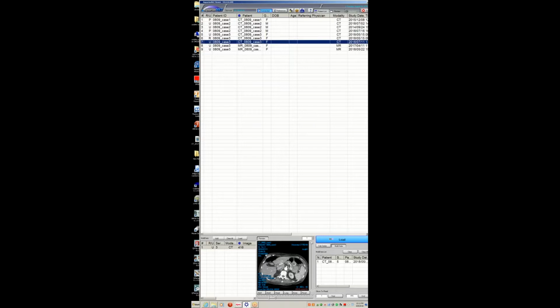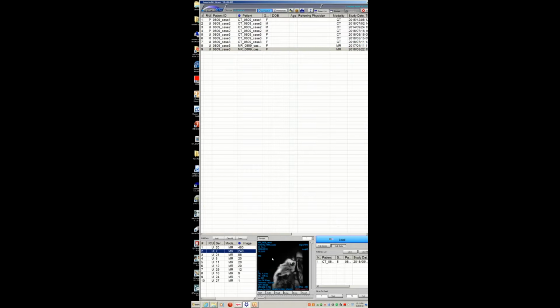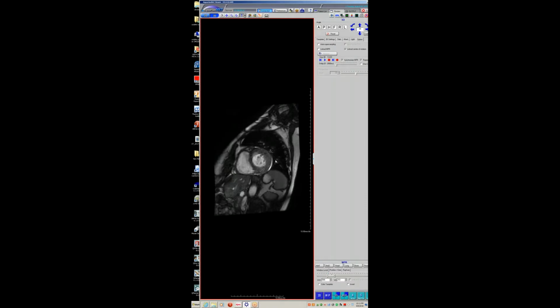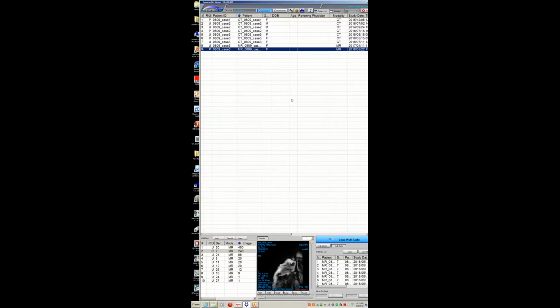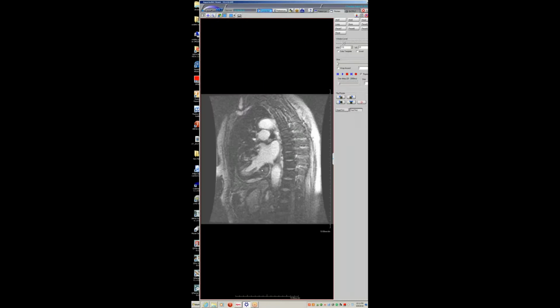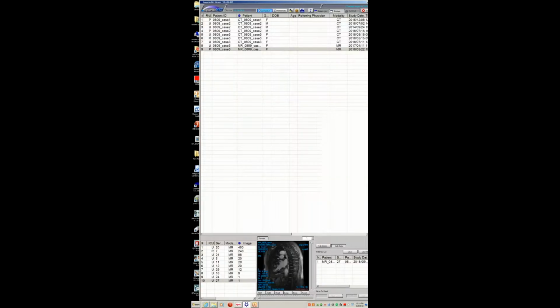They got an MRI for this, and I will try to quickly shoot through these. Let's take a look. But basically, the patient had what looked like just a thickened myocardium, and not really too impressive. So maybe this person has hypertrophic cardiomyopathy, and I'll show you some of the delayeds. Let's do this real quick. And on the delay, you can see that, yeah, there is some enhancement. It's kind of hazy, mid-myocardial. Maybe this is hypertrophic cardiomyopathy.